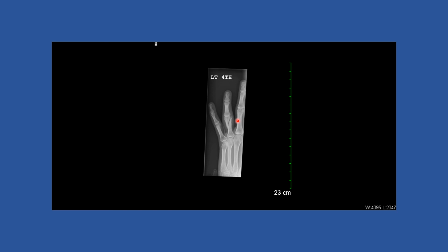Now, for most of your toes, for your great toe, yes, it's very important to decide whether or not there's a fracture because you constantly use that great toe for balance, for movement. Second, third, fourth, and fifth toes, obviously less important. Hands, I think it is always useful to x-ray if there's any question of a fracture.